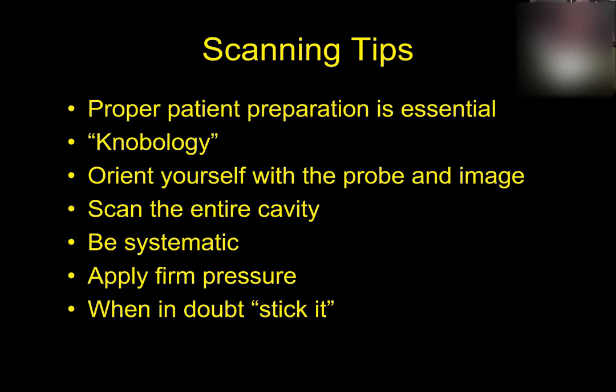Knobology, the fancy word for you got to know what the knobs do. Okay. So you have to know how to set your machine up properly. So you have to know what's the right gain setting, what's the right depth setting, what's the right time gain compensation setting, all those different knobs and things on the ultrasound machine console. You have to kind of know what they do. In general, there's all kinds of adjustments for ultrasound machines. There's probably at least 100 different adjustments you can make. But in general, once your machine is initially set up, hopefully by somebody that knows what they're doing, then as you do the ultrasound, you'll really only have to fiddle with about 4 or 5 different knobs, but you do have to fiddle with them a lot.